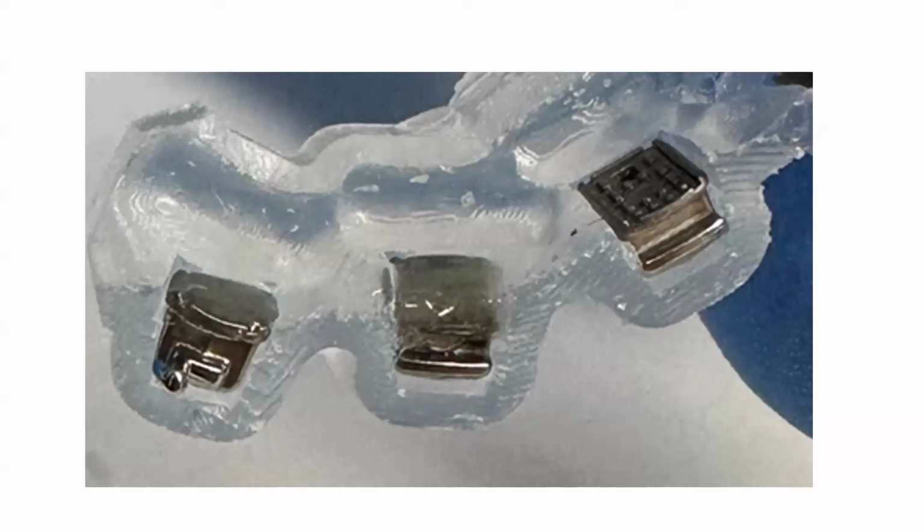In our office, we have one person in each designated office that fills all of the Invisalign transfer trays and the DIBS transfer trays. This way, we're able to give them feedback if they're overfilling or underfilling and really dial in those key players. The goal is basically perfection, but just a slight puff, nothing excessive. We've been quite successful with it. They do not feel that it's any harder to predict a DIBS tray than it is an Invisalign tray.